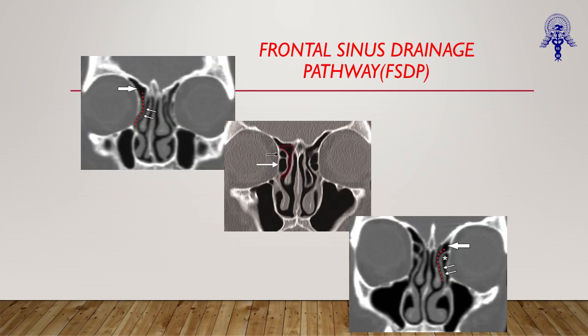Coming to frontal sinus drainage pathway. What is the specialty of frontal sinus? One thing I would like to tell, that when we read our anatomy in our MBBS postgraduate, we read about a frontonasal duct. Like frontal sinus drains into the nasal cavity with a so-called duct. But actually renewed endoscopic anatomy has taught us that no duct exists.